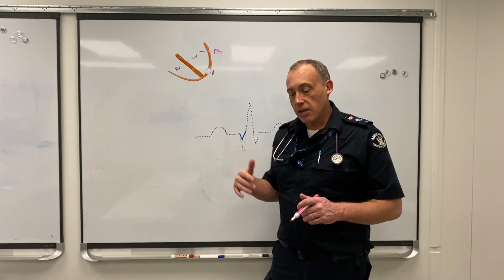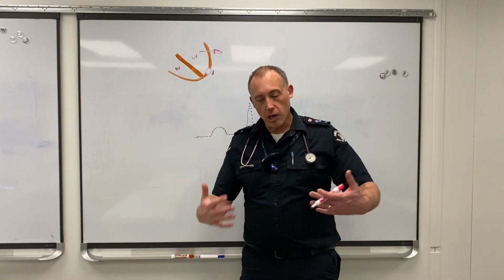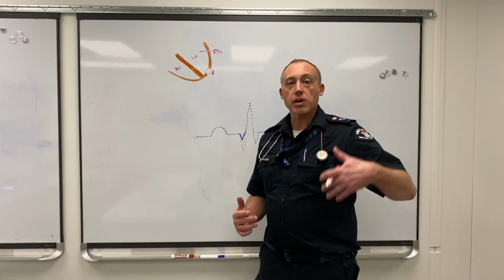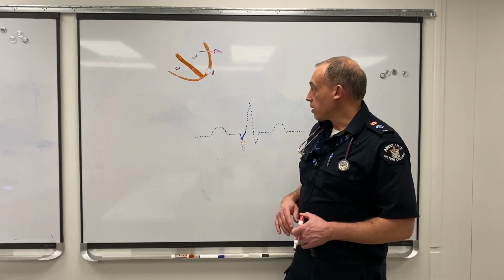Also very important, if you see Q waves, it's really nice to see an old ECG, which we probably don't have, but in the hospital, they're definitely going to want to compare to see if that's a new finding or an old one that fits with their history. So establishing a history of an old MI can be really important. So there you go, little chat on the Q wave.